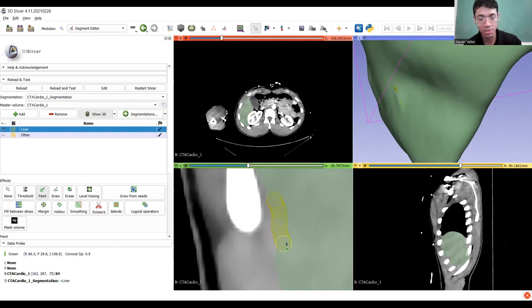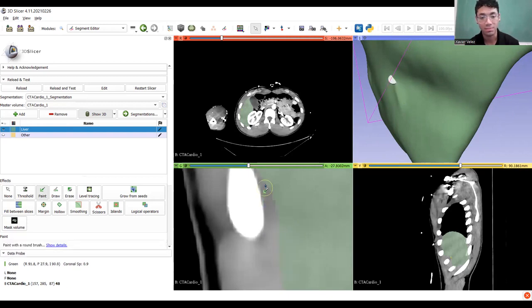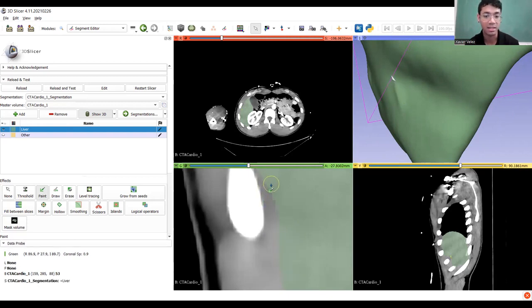Again, this is one of those things where a lot of it will be trial and error, where you'll have to figure out along the way what looks good and what doesn't. If you do this and you're like, hey, this looks terrible, then I think that's one of the good things about saving.